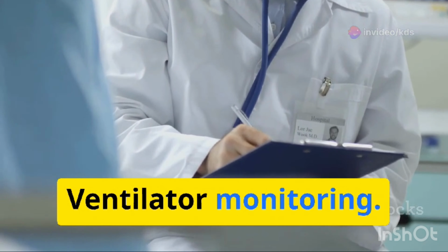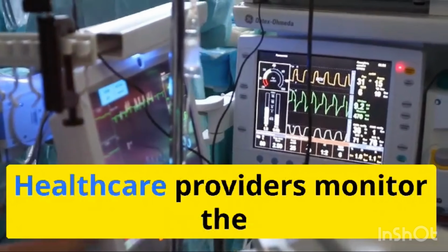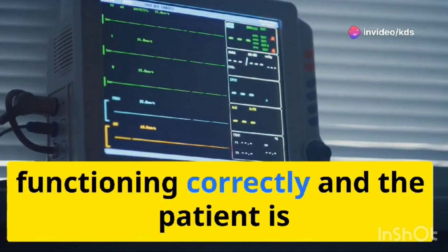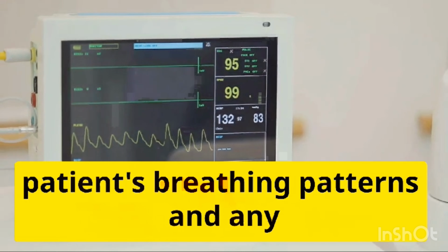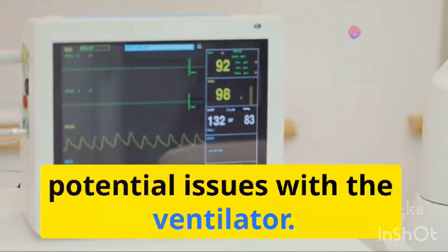Ventilator monitoring. The ventilator itself provides valuable information. Healthcare providers monitor the ventilator's settings, alarms, and waveforms to ensure the device is functioning correctly and the patient is receiving the intended support. These waveforms can indicate the patient's breathing patterns and any potential issues with the ventilator.